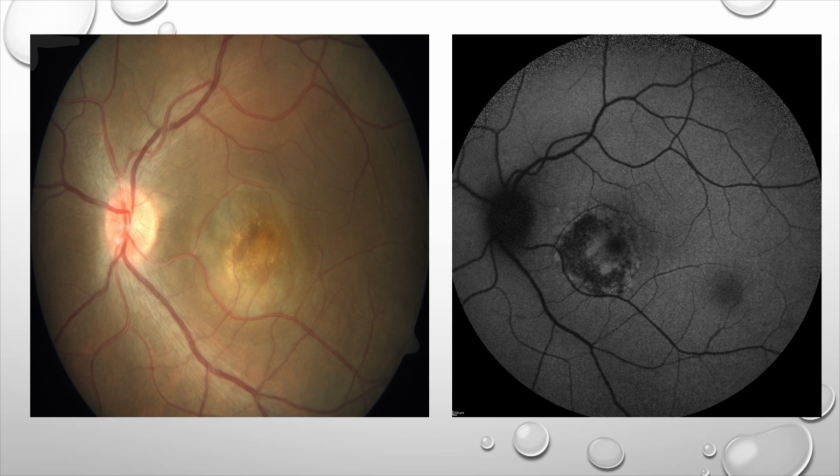The macula of the left eye is showing... So there's something at the macula. So you describe it. Subretinal pale yellow that I can see. Okay. So this is a lesion at the macula measuring approximately 3 disc diameters, causing some retinal elevation. So when you're seeing this picture, what exactly are you seeing? Most important is, are you able to see that there is a difference? Is it a flat lesion? Is it a raised lesion? This is the first thing which we want you to appreciate.